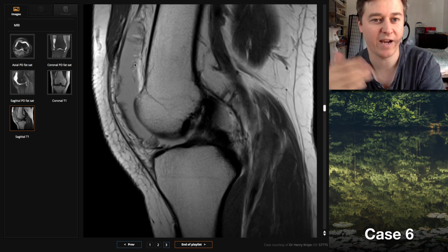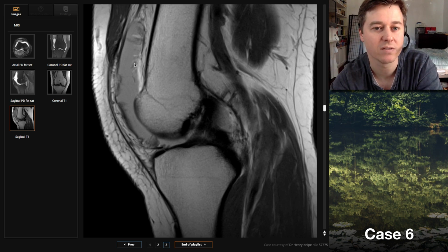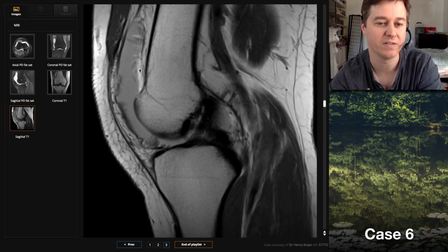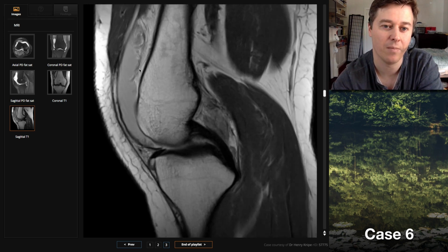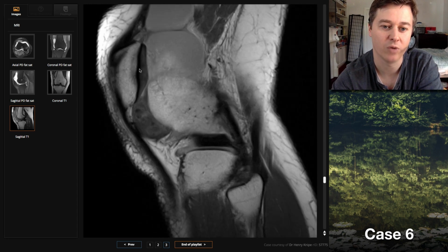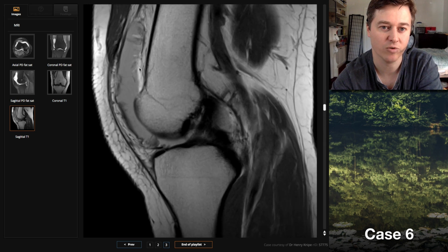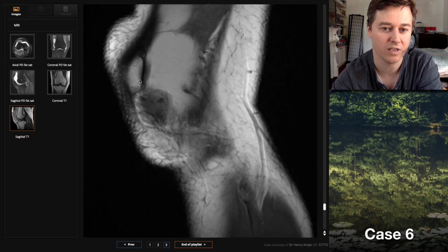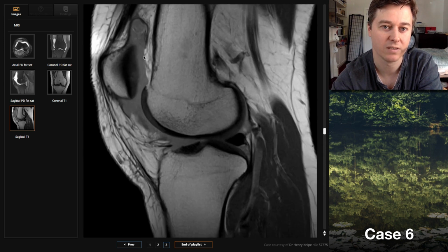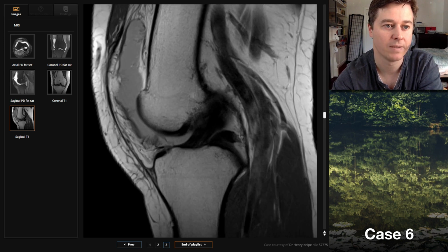So I think this is probably some reactive lipoma arborescens. Sometimes you can get a primary pathology, which is lipoma arborescens, where you get fatty proliferation in the synovium. But it's also quite common to get it as a secondary phenomenon, in patients who have very degenerative knees. You'll often get these frond-like fatty projections in the suprapatellar pouch. So there's definitely a couple of synovial things going on here: the localized PVNS, and also a bit of lipoma arborescens up here in the suprapatellar pouch.